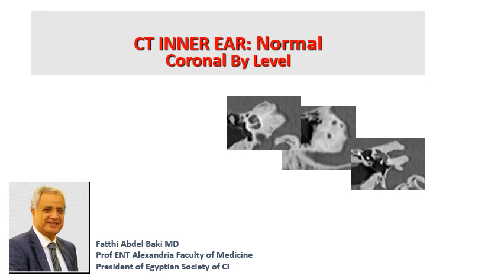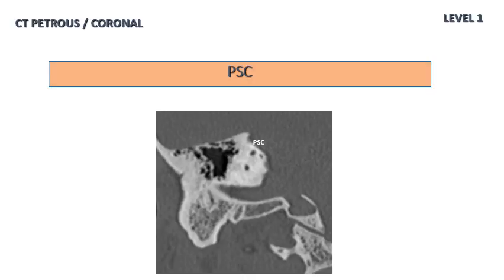Hi, my name is Fatthi Abdelbaki from Alexandria, Egypt, and I'm going to present on the CT of the inner ear in coronal view. I'm going to present it by level, going from posterior to anterior, and I will show the normal findings.